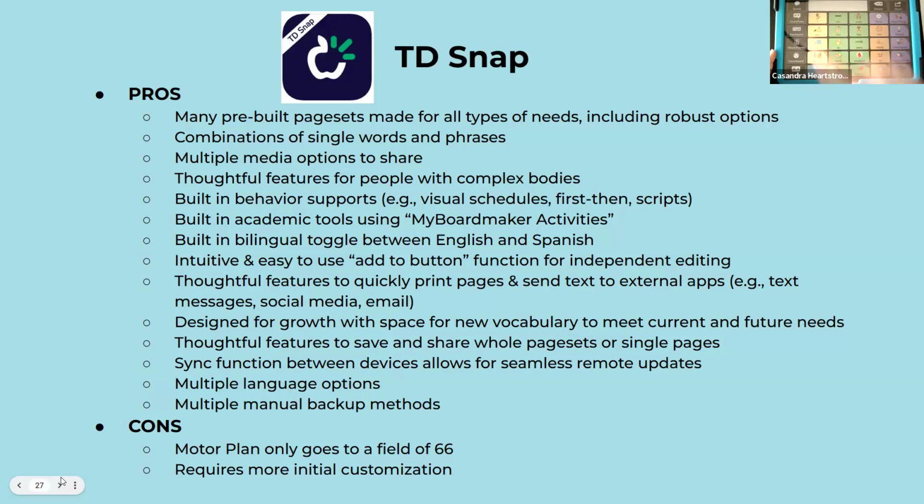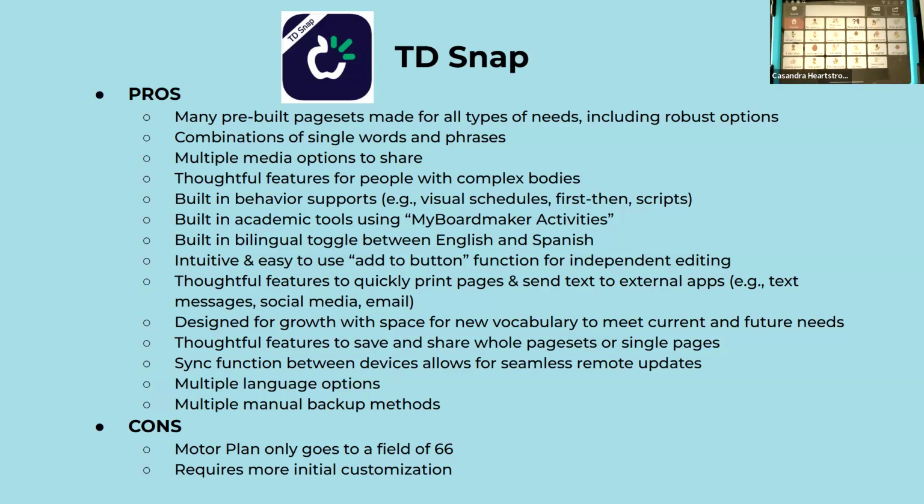Single words and phrases. I don't want to. I agree. I don't understand. Wow, cool. Lots of different options there. You have multimedia options to share. You can share pictures in here. You can share videos. You can have videos that you took on the device. You can have videos linked to YouTube to just show a moment of a YouTube video in there.